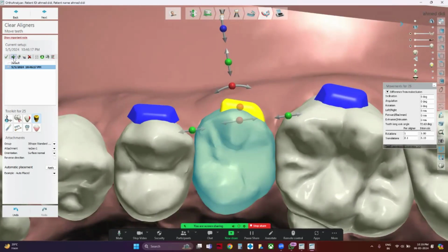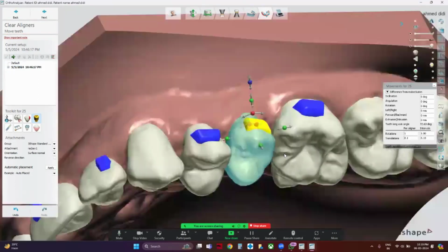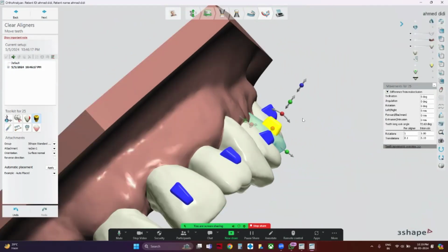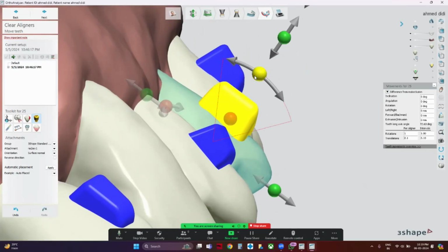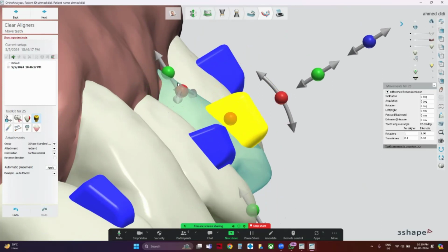So now by mistake, if you made this mistake, then we can try something. One more thing you had asked us, to incline the attachments. So which undercuts, where should they be? Can you show it once again? So let me enhance it a little bit so that you all can appreciate this. Focus on the yellow. So this will be inclined at an obtuse angle from the gingiva.